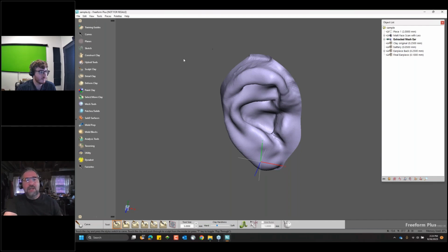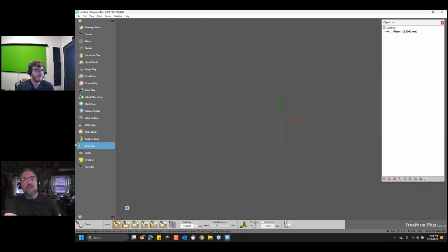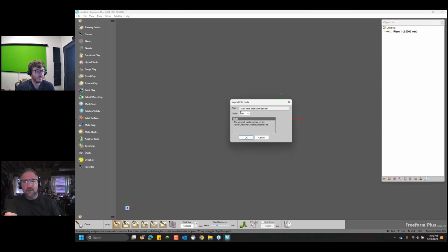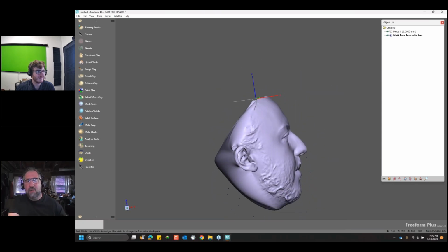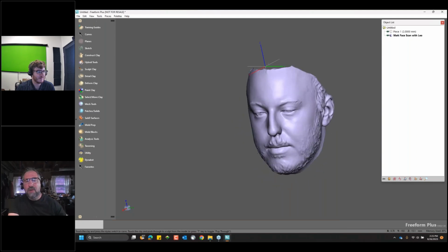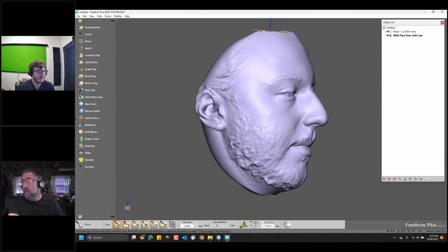Going about this is a little bit challenging to think about, but fortunately, Freeform is very user-friendly, very easy to learn. So I'm going to take the result of a scan. This is scan data that was processed in the exact way that Matt was talking about. And if I do remember correctly, yep, this here is actually Matt's face. You can see that this scan is aligned in the world off of what we expect, but it is a very high quality, very good representation of the area that we're looking for.